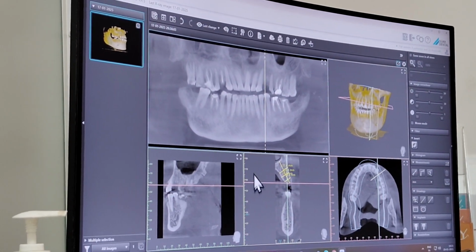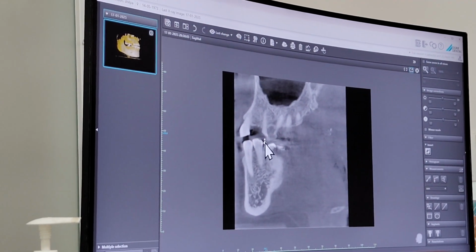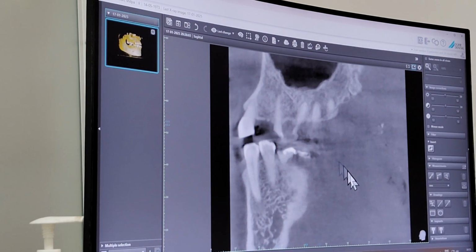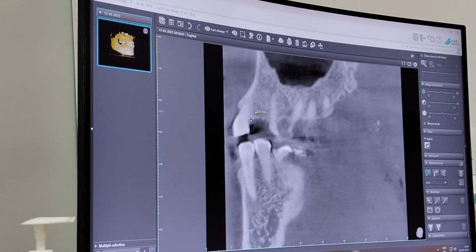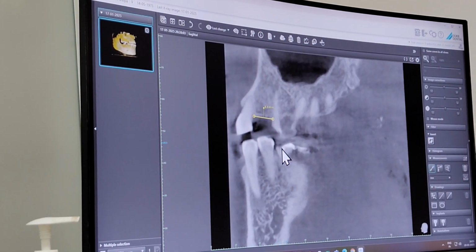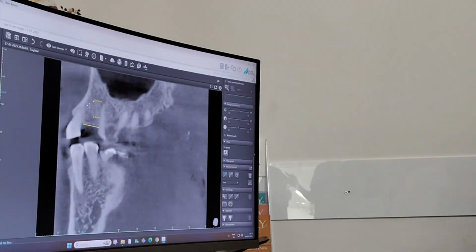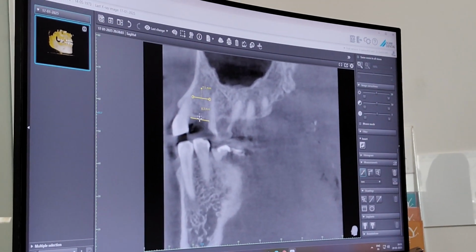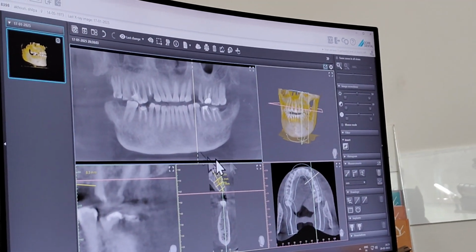Okay? So in this sagittal view, what do we get? We just want to make this. Okay? So what we see here, canine and second premolar. So we will take our measurement from the crest only, from the canine to the premolar. Also, if the roots are convergent, then we take it also at the root apices from here to here. If they are convergent, here they are not convergent. So here we are getting 8.3. Okay. So how can we plan the implant?